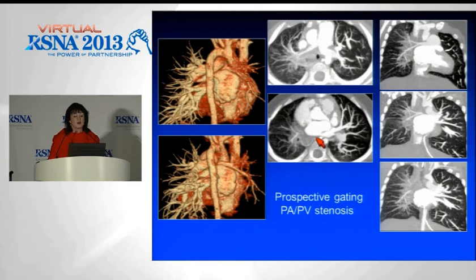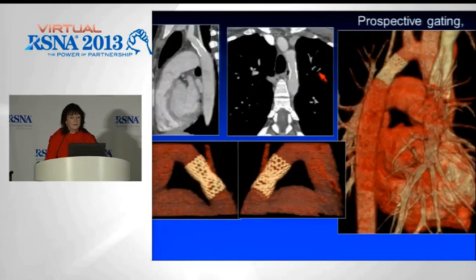So the pulmonary veins are all occluded by this big soft tissue mass. And this was a prospectively gated scan, which very nicely shows you, if you look at the back of the heart, you can see tiny pulmonary artery, nothing coming back, hardly anything going into the lung. And this patient had a fungal infection, Aspergillus infection, which was angioinvasive, invading the lung, and they basically switched off all perfusion to that lung, and the lung is now non-functional.